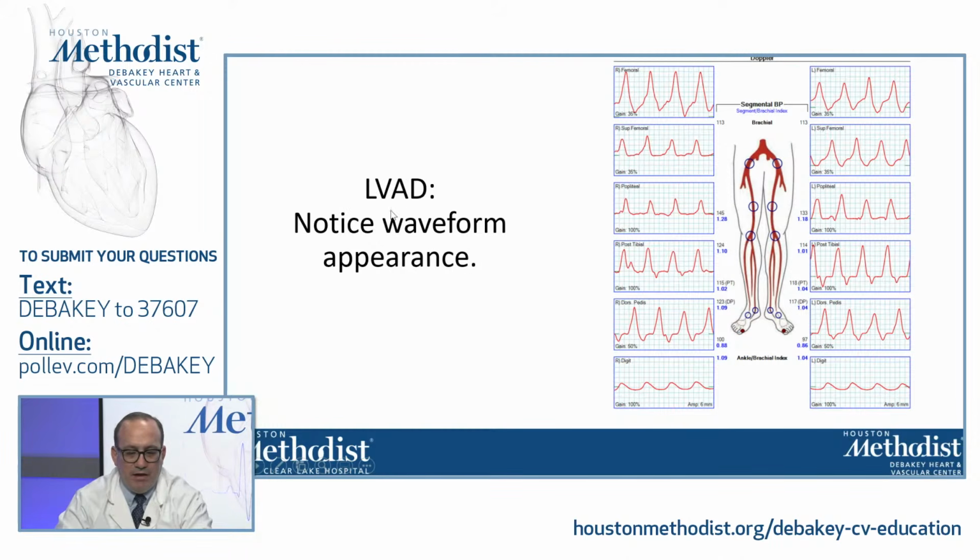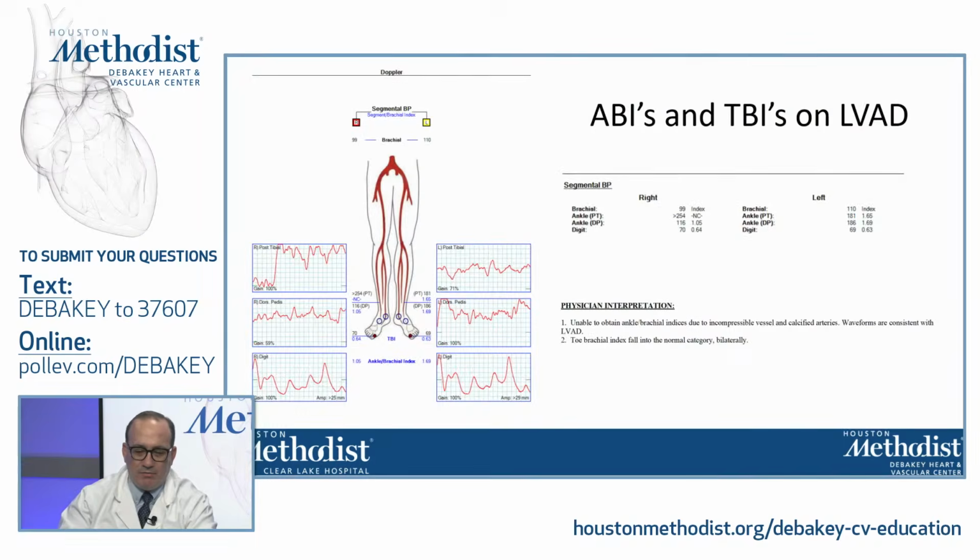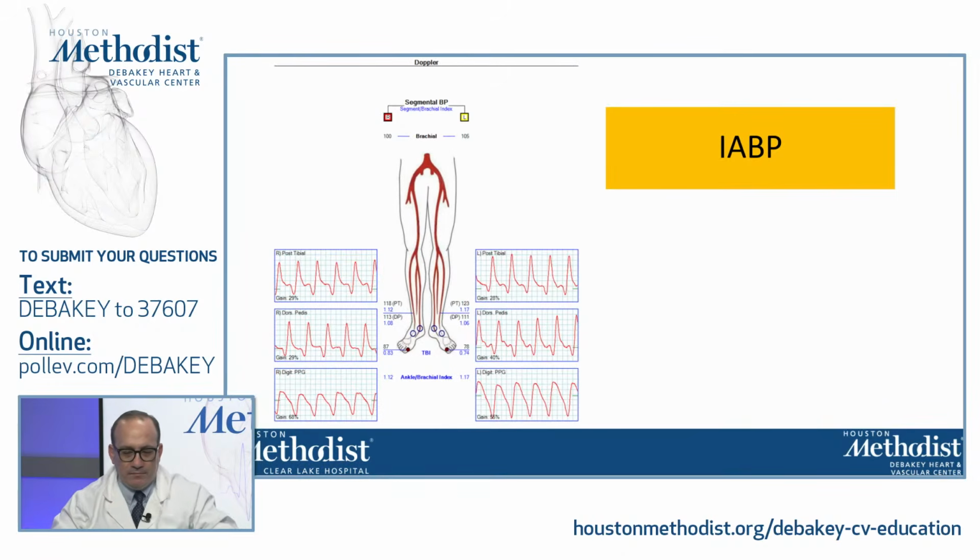Again, this patient has an LVAD. Notice the waveform appearance. You lose the triphasic waveform appearance. It becomes almost monophasic or biphasic at times. This patient is again on an LVAD, and again the waveform morphology, it's like you can't tell that there are waveforms. It looks almost like noise.